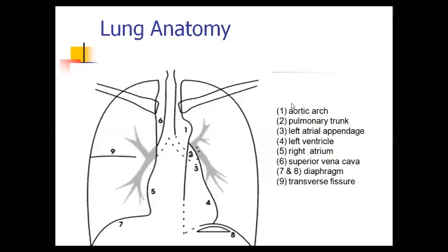Lung anatomy or chest anatomy on plain X-ray films. Usually on every plain X-ray film you can identify first of all the so-called lung fields, left and right, and the middle shadow, which is formed by the shadow of the heart and great vessels.